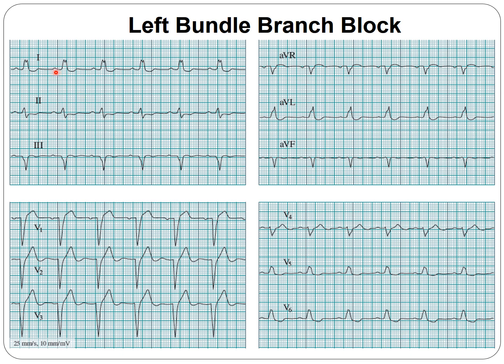Looking at this tracing, rhythmic heart rate about 75. P wave, yes, we do have P wave, the PR interval is normal, QRS is wide. Looking at V1, that's a QS complex. In V6, we have a wide R wave. Similarly, in lead 1, we have a notched R. So that represents a bundle branch block in this case.